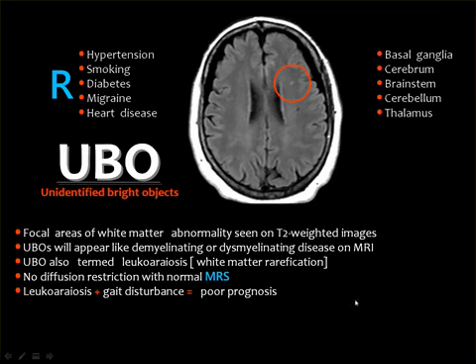The literature says that this lesion may represent an ischemic focus, may represent a dilated Virchow-Robin space, may represent a demyelinating lesion, and sometimes patients with long-standing headache develop multiple foci in the white matter, which are known as headache-related.